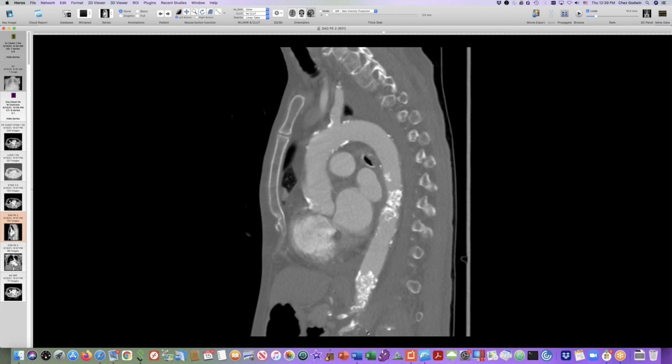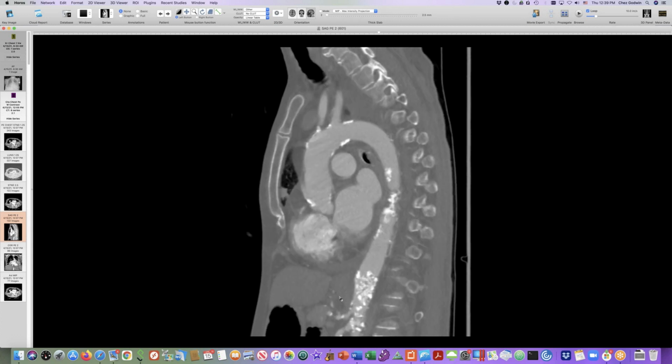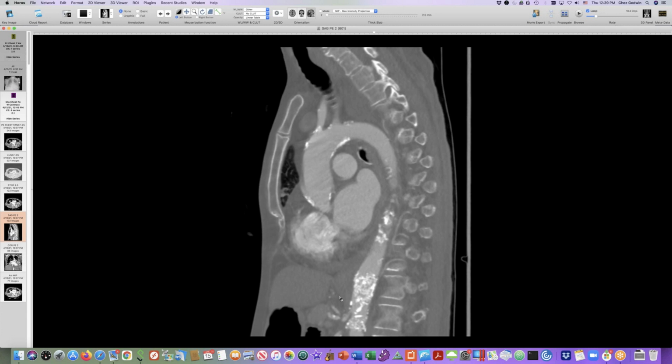Is there anything vaguely like that in that proximal left subclavian artery, or is it just atheroma up there? I think the stuff we're seeing here all seems to be in the wall. Here we're skimming the wall. It doesn't seem to be in the lumen the way this stuff is. I was looking at other vessels trying to find the same pattern. It looked for a while as if it also went onto this mesenteric vessel here, but that vessel is small enough that once again, I think we're probably just seeing the wall and not something in the lumen itself.